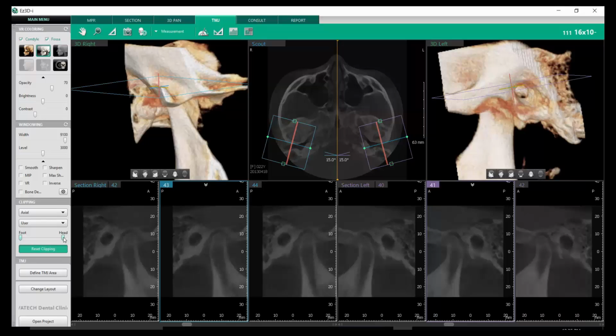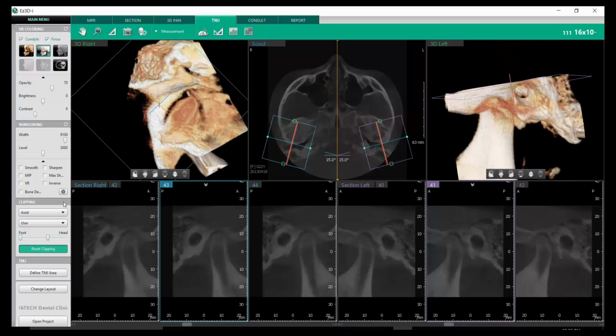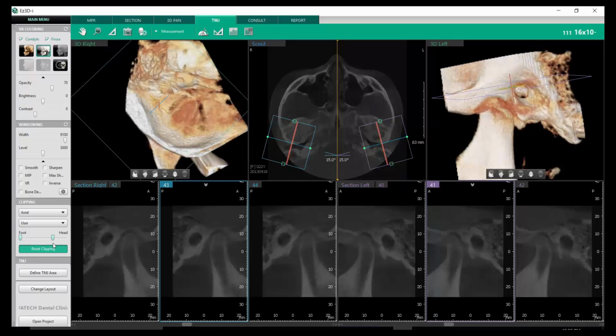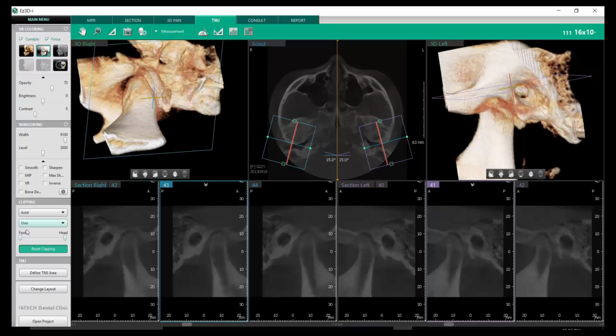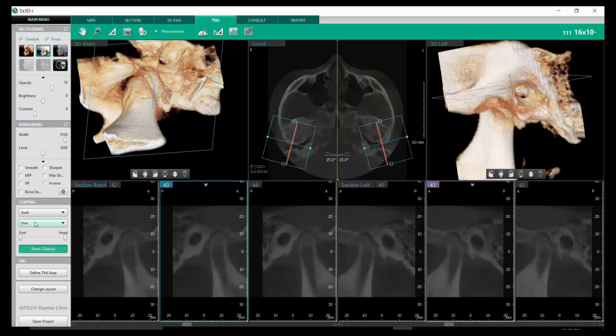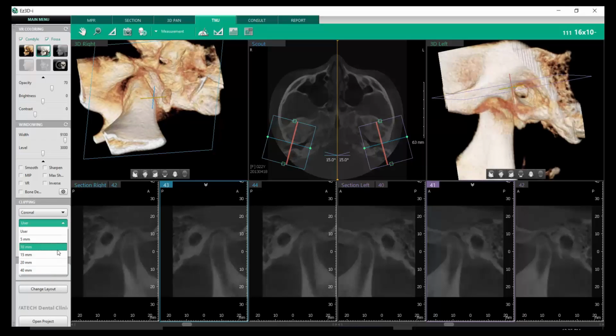You can also do the same thing for axial, where you want to go from superior to inferior border of your defined view, or going from the foot up. And then lastly doing the smart view, and then clipping accordingly. You also have the variable to adjust the thickness of how much anatomy you're clipping.